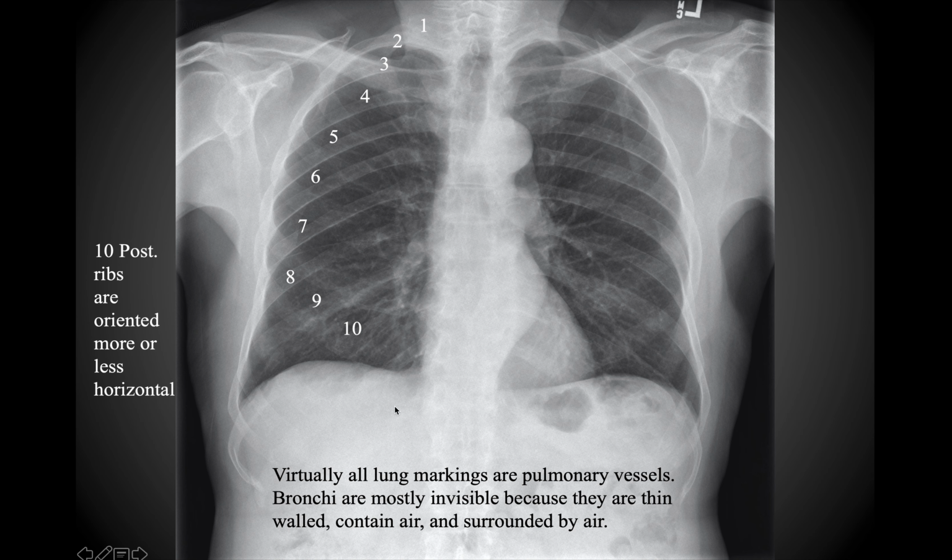And I think on this one, if you look really closely, you can also appreciate the 11th and the 12th ribs there as well. So again, this is obviously a very good chest x-ray for viewing bony landmarks. And the way that the x-ray tech takes the image, they can adjust the voltage in order to better appreciate the bony structures versus some of the soft tissue or lung structures.